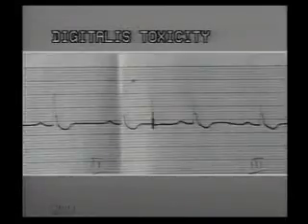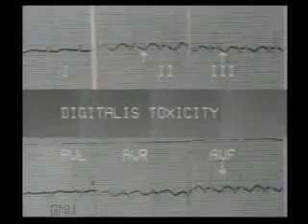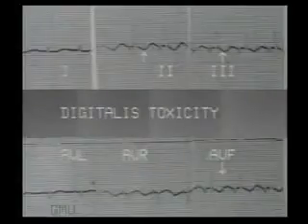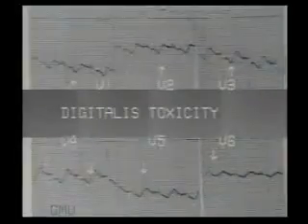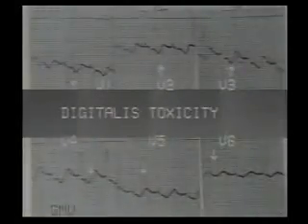In this ECG, once again, the characteristic ST segment depression of digitalis toxicity is seen. With further toxicity, the T wave becomes flat or inverted and various cardiac arrhythmias may appear, commonest being ventricular extrasystoles, ventricular bigeminy, progressing to ventricular tachycardia. Also remember that the ST depressions of digitalis toxicity are seen in many leads, anterior as well as posterior and chest leads.